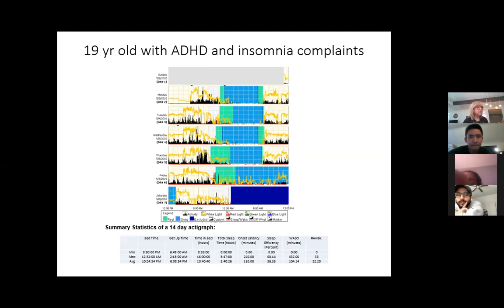And then waking up, lights are on, activity. Red is the machine saying these epochs are more likely to be wake. I think I used the diary to assign the colors because I edited this. Here you can see not much activity, but maybe the guy told me he was sleeping, but he may not be sleeping. This is the real truth about actigraphy and how difficult it is.